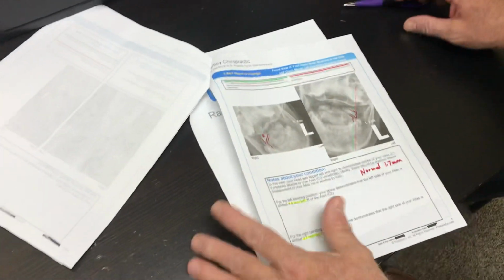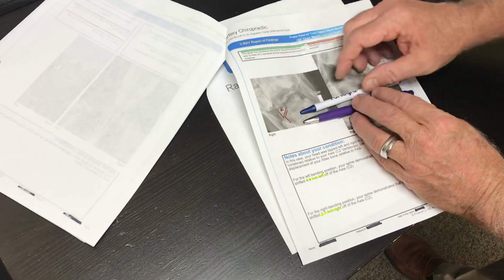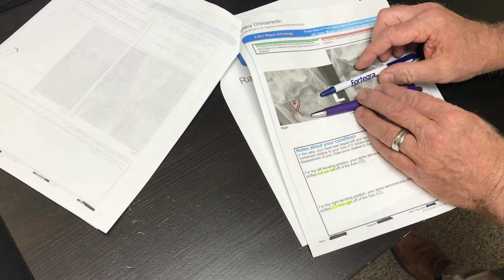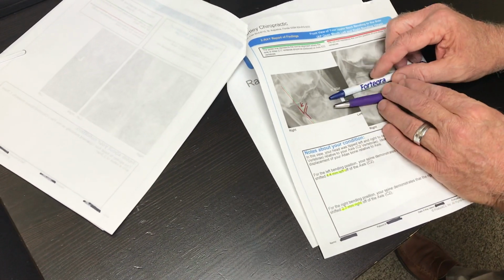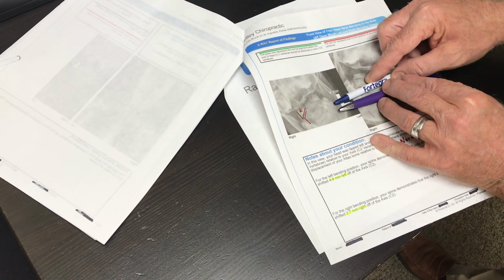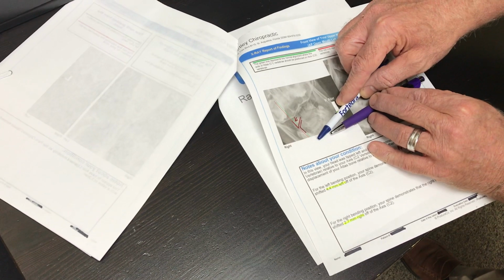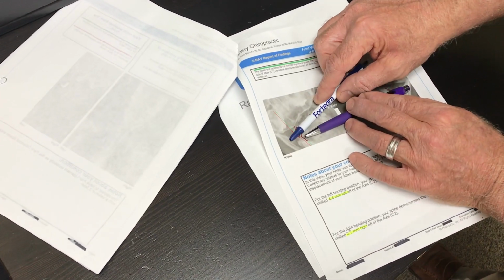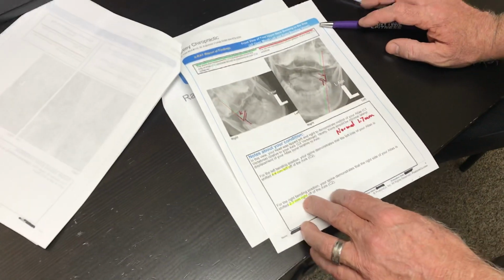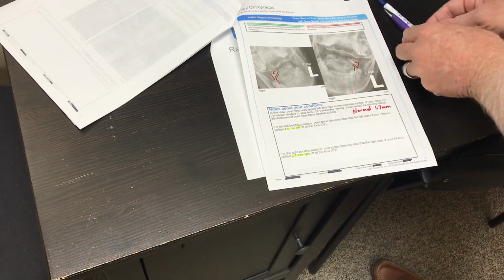So on this patient, the edge of C1 when they tip, which is right here, slides off of the edge of C2 is right here. So normally when you tip, it should go just like this, staying one on top of the other. If there's ligament damage, then it's going to slide, okay, like that. Okay, so on this patient, when they go to the right, theirs is 2.7 millimeters. Normal is 1.7 millimeters or less.